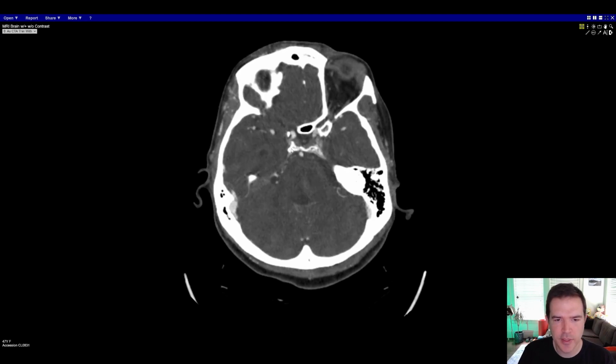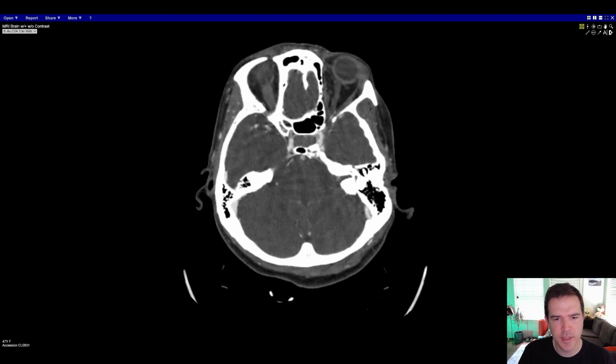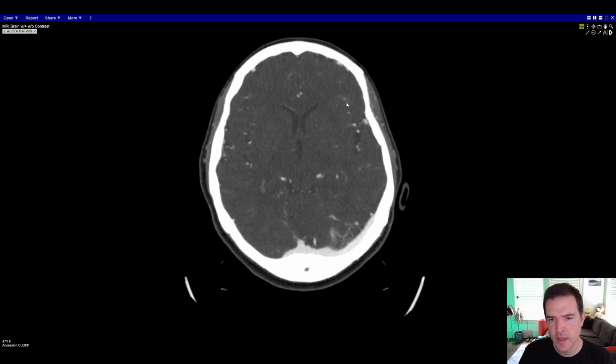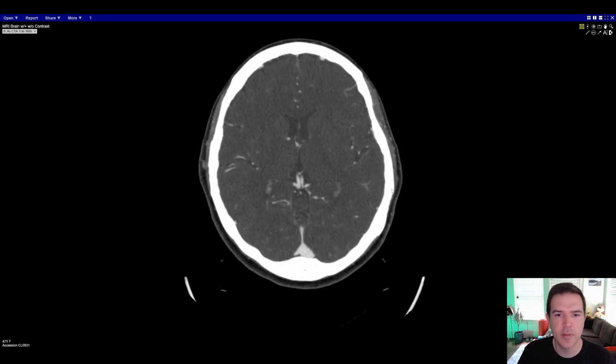Now we can come up and check out the intracranial vessels if we're fully following our search pattern. We can follow the ICA here as it becomes the MCA. We see nothing too serious going on with those MCA branches. And if we follow this ICA up, it looks okay. Again, the MCA looks all right. We don't have any big proximal occlusion, but based on the size of those abnormalities on the MRI, we don't really expect it to be a big occlusion.